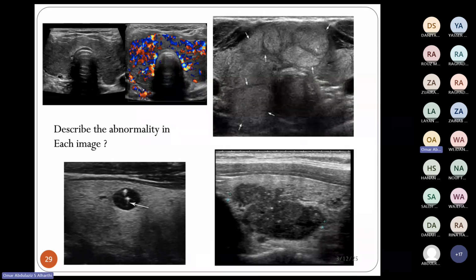Okay, so we're almost done. What is happening here in this exam? Doppler. It's Doppler, yes, but what is the pathology? What is happening? Increased function of the thyroid. So we cannot assess the function. It's not a functional imaging, but I agree. Yes, I think you want to say the gland is enlarged and hypervascular. Yes, which is seen with Graves' disease. Yes, excellent. What about this one?